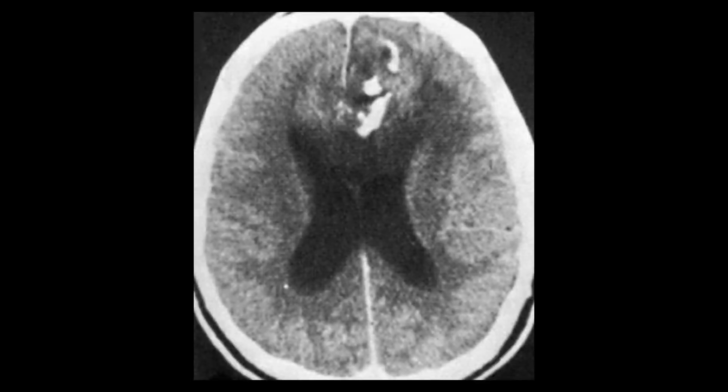There will be some other reason for the hydrocephalus, but apparently on this particular CT image you are able to see the oligodendroglioma with significant calcification, which is the characteristic of oligodendroglioma, always occurring in cerebral hemispheres, hypodense in nature, and with the presence of calcification. In 20% you may be able to see hemorrhage within it.